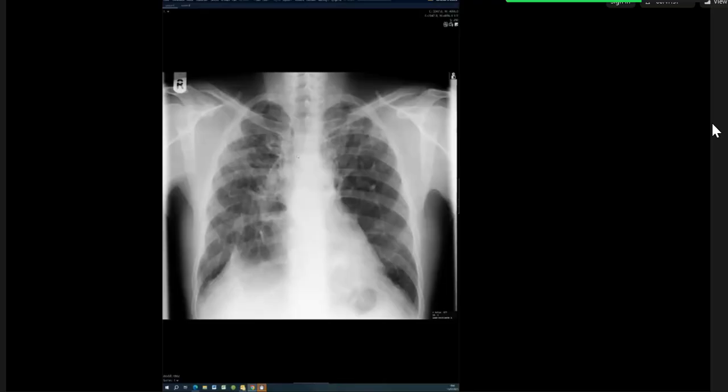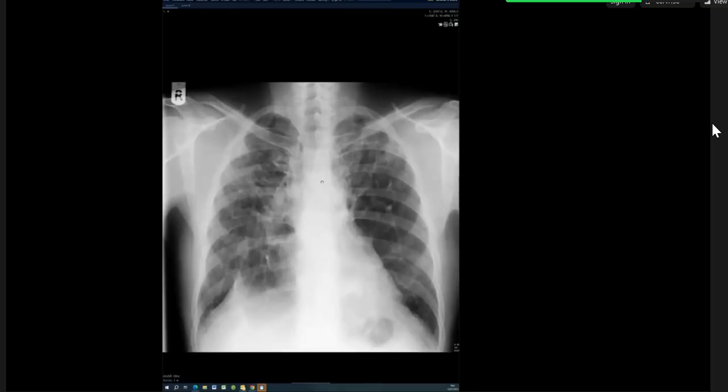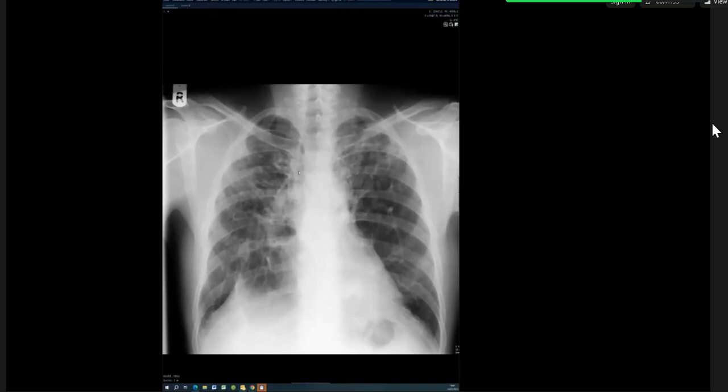So you said pneumoconiosis because of... tell me the reasons you've gone down. Because of the opacities in the bilateral mid and upper zones with a pattern of coalescing, like conglomerate masses. Okay, I think you've jumped a bit there. You're right, there is upper to mid zone. Have you said the word fibrosis yet? Yes, ma'am. So upper to mid zone fibrosis. Focus on describing that first so you can get all those points.